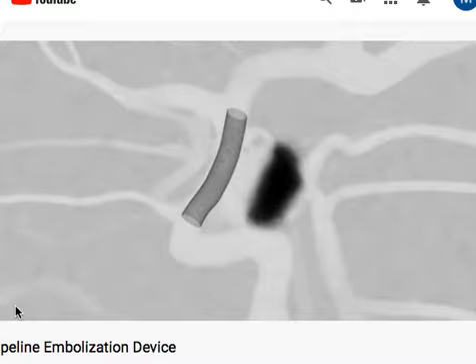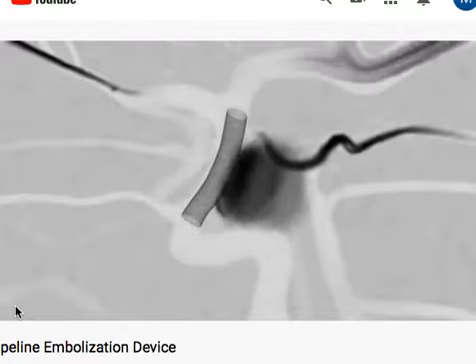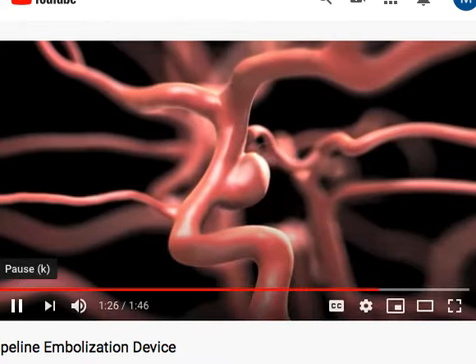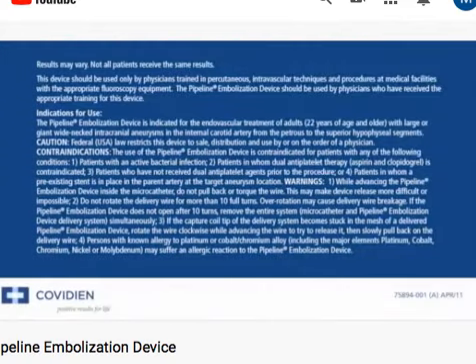In effect, this stent immediately causes stagnation of flow and decreased flow within the aneurysm, as you can see with this simulated angiogram. With time, over a matter of 2 to 6 months, the aneurysm will completely clot off and shrink away, essentially forming a normal blood vessel.